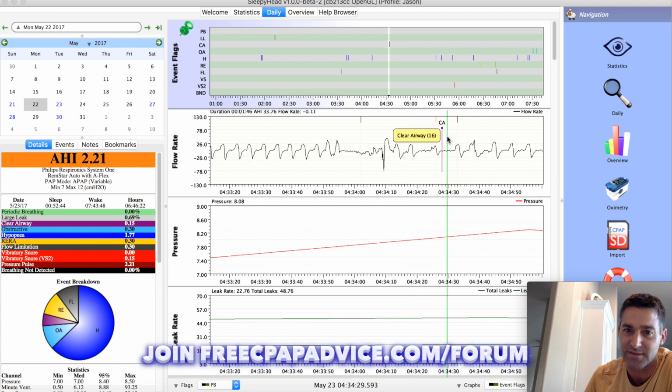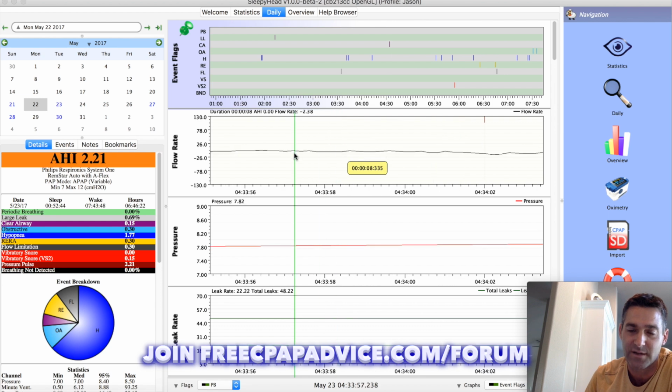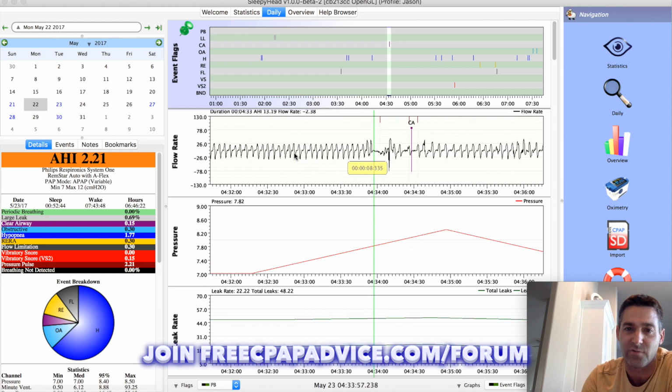Well, you can tell it's not even flat where it's tagged, and then this period, technically that's not even long enough, so it's marking stuff when it shouldn't be marking things. So if you see a bunch of central apneas, take one look at it, and anything like this is pure doo-doo. You need to have a nice flat line that just comes out of nowhere. Oftentimes you'll see a waxing and waning to it. It'll look like a football.